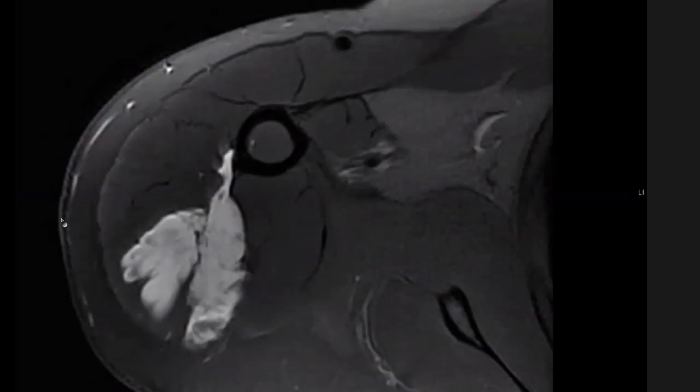And this is a fat-suppressed non-contrast study. So what are you seeing? This is a fluid-sensitive sequence, isn't it? So this is hyperintense, right? Okay, good. What about these areas there then? What are these abnormalities? Low signals, yes. What are these low signal abnormalities then? Low signals are calcified or hemosiderotic. Excellent. Good.